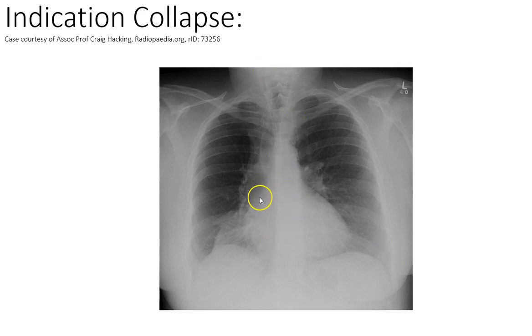The next thing I look at is the heart, and that's a little bit sort of 50-50, isn't it? It's not too much, but maybe a little bit more off to the right than I might have expected. And it's about the right size. The next thing I look at is the trachea, and I'm going, oh, what's this trachea doing over here? Look at that. Can you follow that? The bifurcation into two main bronchi is here, and then we lose it.